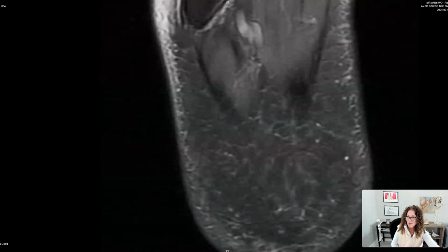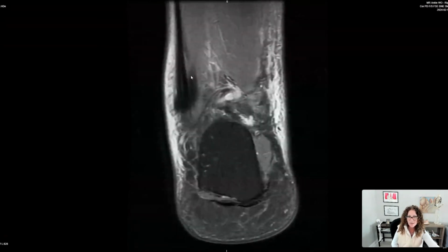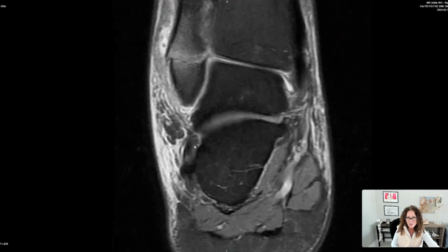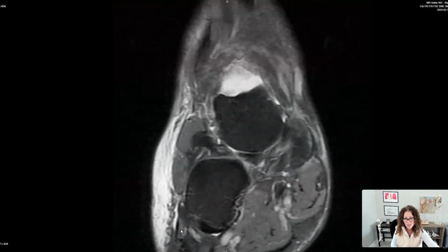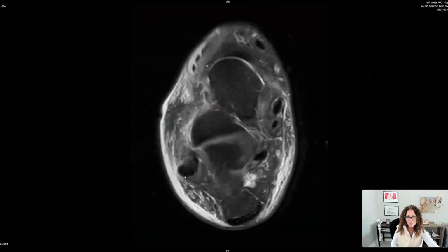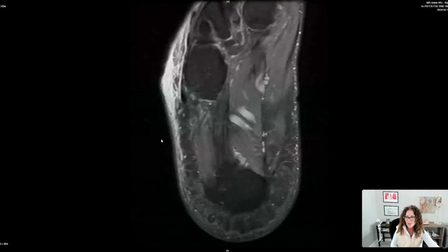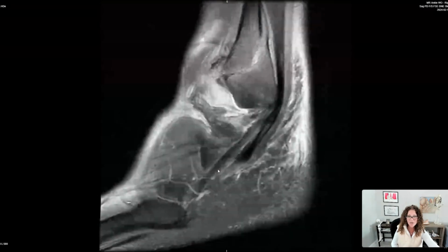One of the places I'm going to want to look at that is going to be a coronal image to understand. There's my medialized peroneus brevis. It's rejoining here at the inframalleolar groove with tendinosis. It's larger, and then to its insertion with a small split at the insertion itself. Going back to those axial images again now, I can appreciate my peroneus longus with tendinosis as it moves towards the cuboid tunnel. Magic angle is limiting me there. Let me see what I can see on lateral sagittal imaging, and I can appreciate here's my longus.